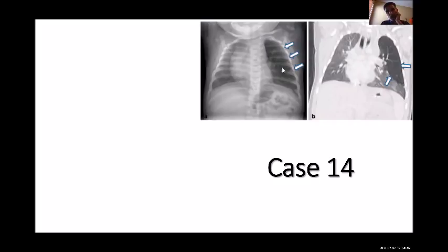Okay, and you're right, there is a difference. That's very good. If you say that in the exam, even if you don't know the diagnosis, that's very good. So what is your differential diagnosis? Congenital emphysema or cystic adenomatoid malformation. Wow, who said that? Surah. Yes, me. Okay.